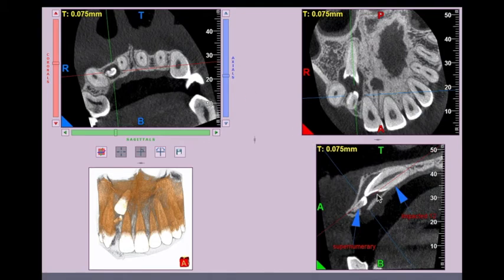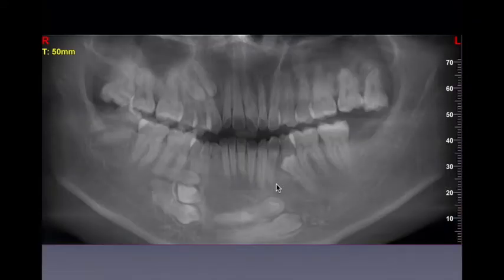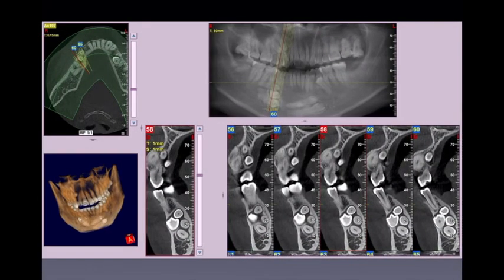Another particular case of an impacted tooth with a supernumerary dentition, preventing it from coming out. Signs of possible cystic formations also evident. Multiple impacted supernumerary tooth could be very well assessed with three-dimensional images as it tells us where these teeth are located or found. So definitely it will be very hard for anyone to determine how to remove all of this without the help of three-dimensional imaging.